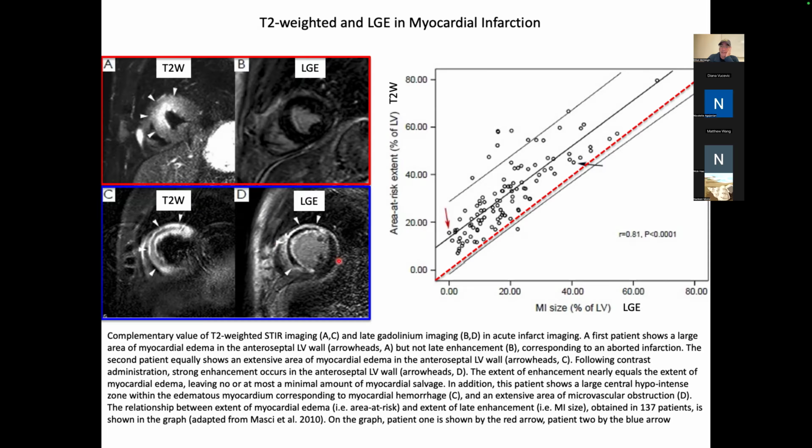They change quite dramatically after 4 weeks, in that we have this late contrast on the epicardium and on the endocardium, all the way around here. There's a very dark section of tissue here, and what's going on there is that gadolinium just did not get into that tissue at all. So it's basically blocked off entirely. It's sort of like a hemorrhage in the tissue. And when you have a hemorrhage, the blood congeals and forms hemosiderin and all of that stuff, and then the tissue locks down as a long-term hemorrhage. This is what it looks like.